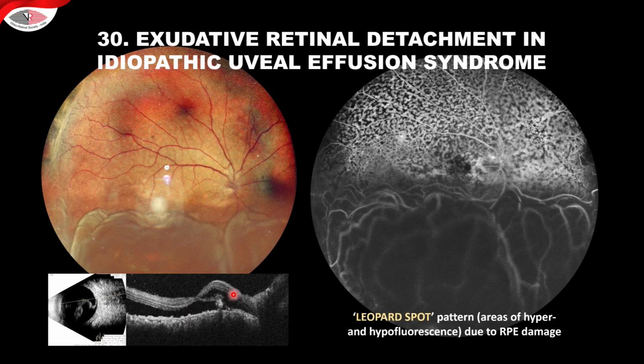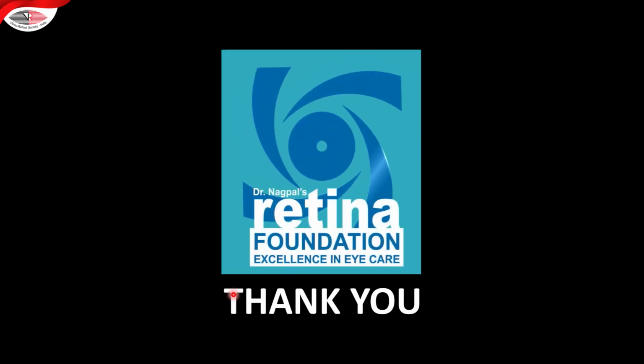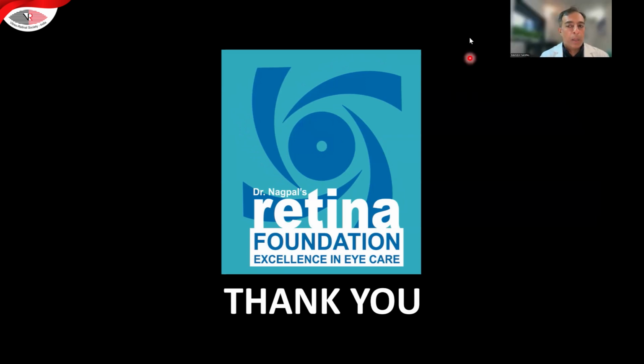So in today's times, we do a lot of multimodal imaging. I was talking to you through this series on the role of fluorescein angiography to a large extent. But I think today we rely a lot more on multimodal imaging. So I've showed you glimpses of fluorescein angiography, of course, being done for a lot of entities. But alongside, I've shown you the role of OCT, role of infrared imaging, role of autofluorescence, role of OCT per se. We correlate all these things, ICG also to some extent.